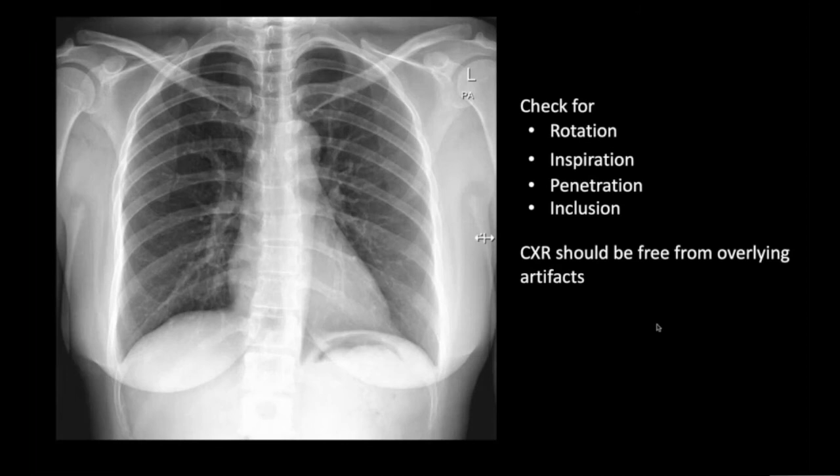Image quality of chest radiograph. After you have checked it is the right radiograph for the right patient, it is important to identify whether or not the radiograph is technically adequate. Without this crucial step, you may diagnose disease that is not genuine. If the image is not of best quality, but the clinical question can still be answered, a chest radiograph need not be repeated.